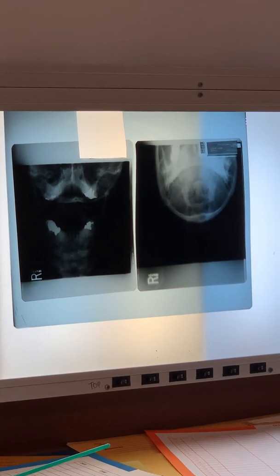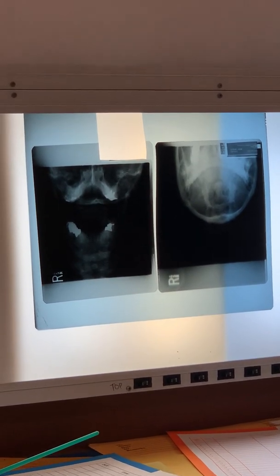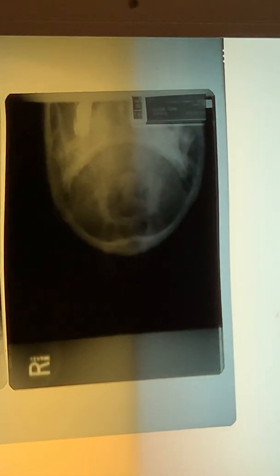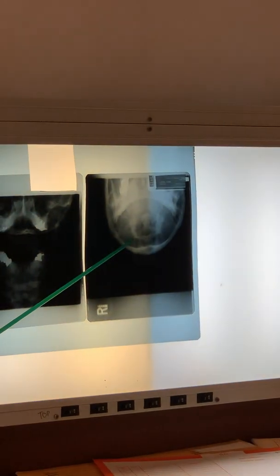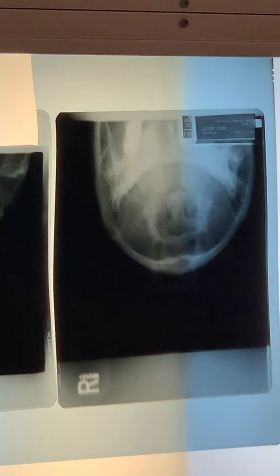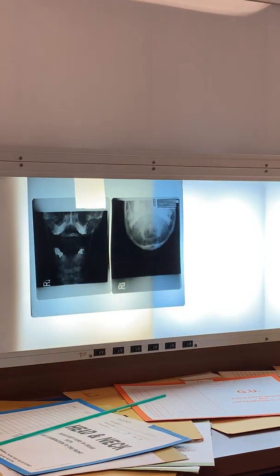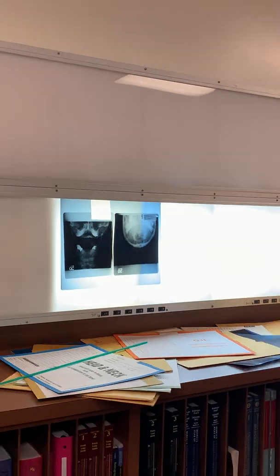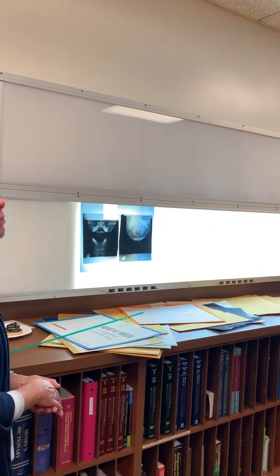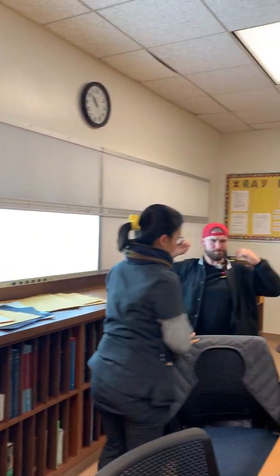It's split. Odontoid split. So the odontoid process is split right there. Couldn't see it here, it was too dark. So they did a Fuchs and a fracture there. All right, I'll let you guys go. How would you fracture that like that? On your head. Could be a smash, it could be similar to hangman's, kind of hyperflexion or hyperextension.